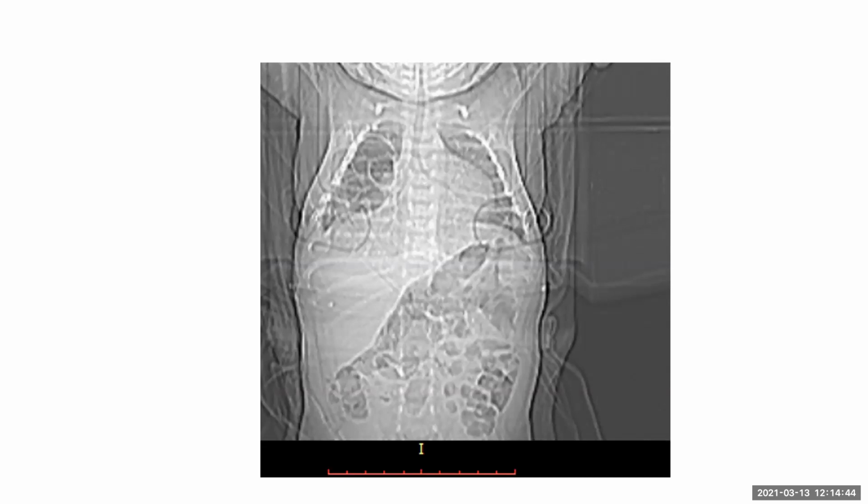In fact, there is loss of definition of the diaphragm. So I would keep a congenital diaphragmatic hernia as my prime possibility. I would inform the clinician, because this causes respiratory distress and pulmonary underdevelopment in the child. And a CT axial cross-sectional imaging would help.